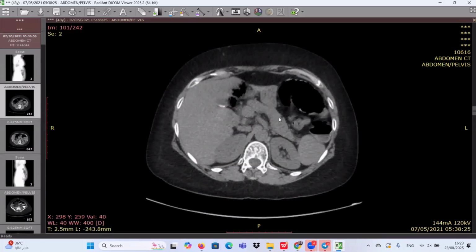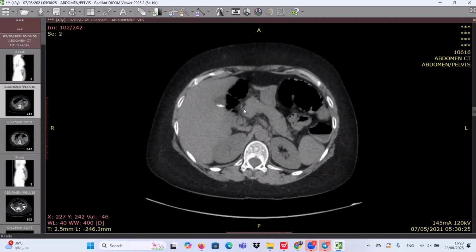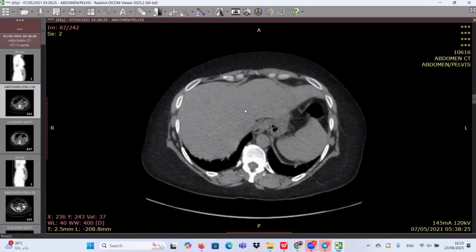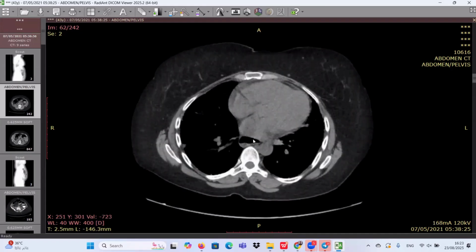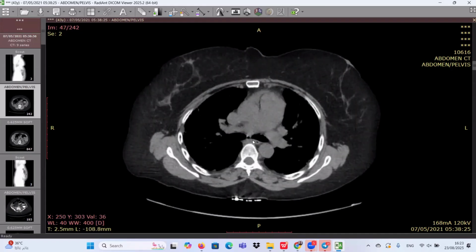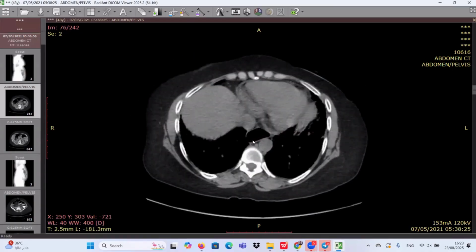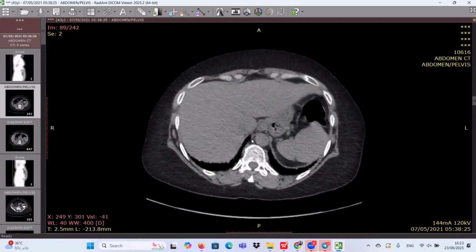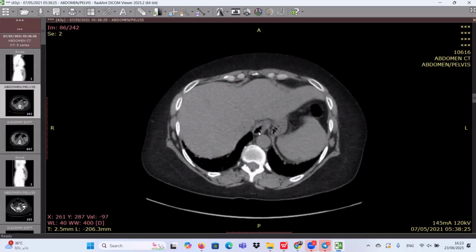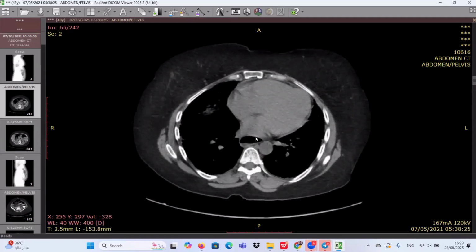We have gallbladder stones, as you see, with some layering hyperdensity in the gallbladder as well. To save your time and the time of the whole audience, can we check the lung, please? The esophagus is patulous and dilated, and the gastroesophageal junction is grossly unremarkable in this confinement, and I would like to review the lung windows as well.